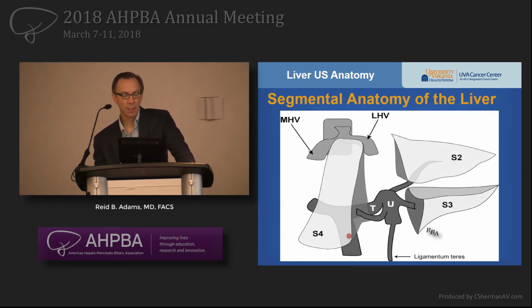On the left side, again, main portal vein, here's this transverse portion that runs at the base of segment 4. It comes up into this ascending portion of the left portal vein that then gives off branches to 2, 3, and 4, and the first branch that comes off, as we'll see in a few images and you'll see in our models, is the segment 2 branch coming off. And then just before the portal vein terminates, you see the segment 4 and segment 3 branches coming off.